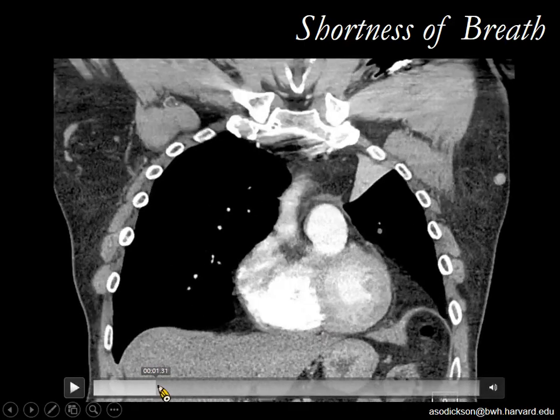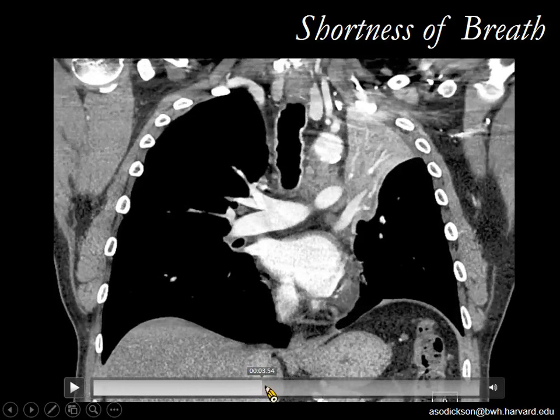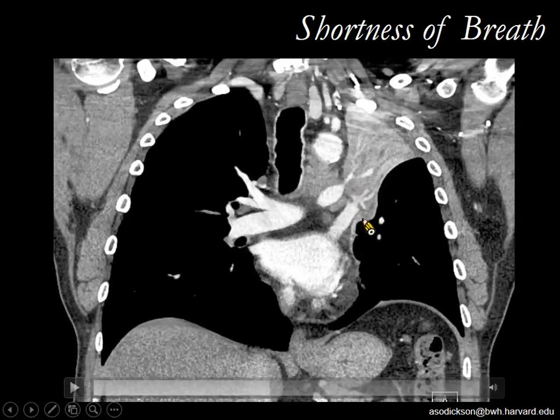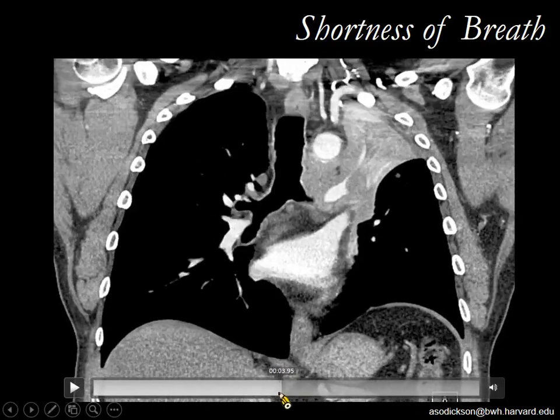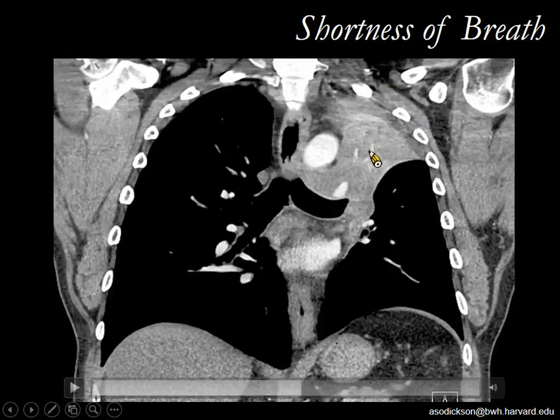And here we go. So coming through the same image, there we see the left upper lobe is collapsed. That's that border that we were seeing in the upper part of the S. And as we come a bit lower, we see this outward bulge here from the lung cancer that is roughly located here. It can be difficult to distinguish the lung cancer from the parenchyma, though perhaps you can see that there is a bit of a difference in the enhancement, with a little more enhancement in the lung and a little less enhancement in this mass here.